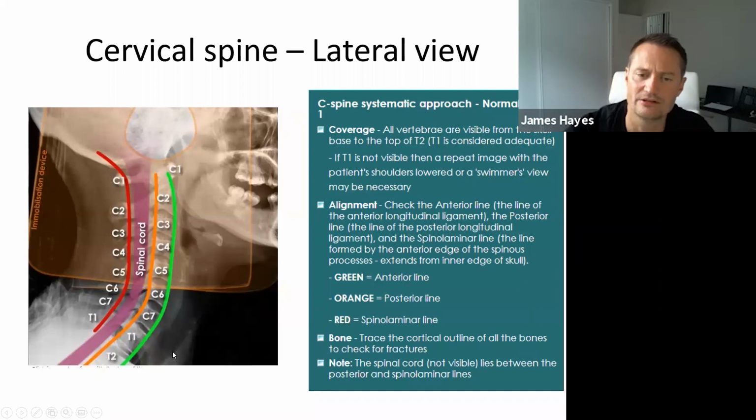All right. You won't be involved with taking this patient's hard collar off until this has been cleared by a radiologist, I would suspect. But it's very useful for you to be involved when you've had a look at these x-rays. Catherine, I'm happy to take any questions now on the bones if anyone wants.